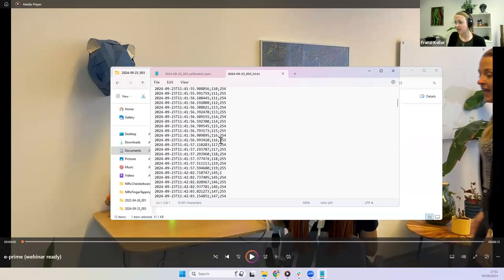during the experiment. As Gretchen showed earlier in E Prime, we have the 254 and 255 for our two different stimuli as they were flickering. And obviously this video was cut a little bit, so we didn't see all 15 blocks of the checkerboard.